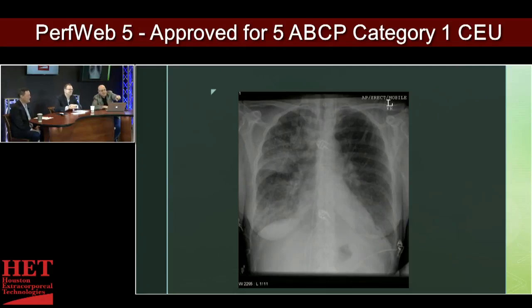Okay, so do I see that same wedge in the right, like middle lobe, where it's a pulmonary embolus? You're talking about this opacity here. Yes, I noticed that too, but I couldn't tell if that was vascular, or that thing you were talking about, or is it something else? So let's back up. Let's start with the soft tissue structures. You want to jump to the pathology, and I think that would probably be a mistake.